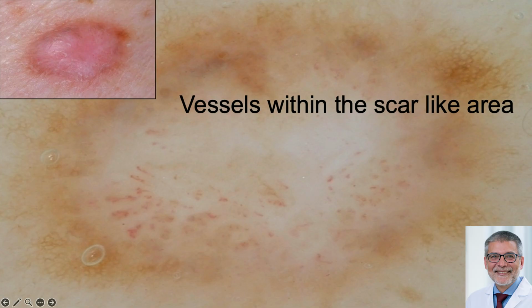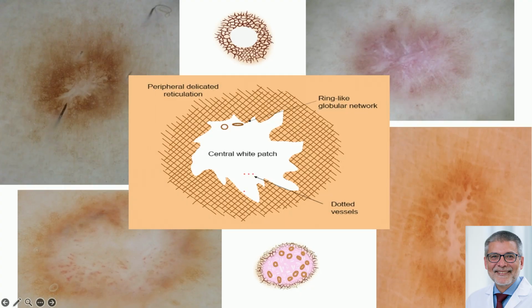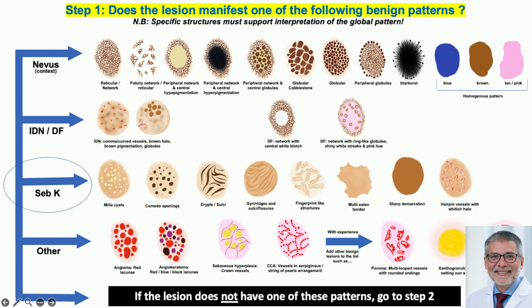and dermoscopic together. The take-home message is that a dermatofibroma, number one, should dimple, and number two, should only have these structures and nothing more, right? If you add anything else to this, you add a globule, right, or some blue color or anything else, then even if it dimples, you've got to be thinking along the lines of cancer, okay? So only these structures, only in this pattern, and only if it dimples is it a dermatofibroma.